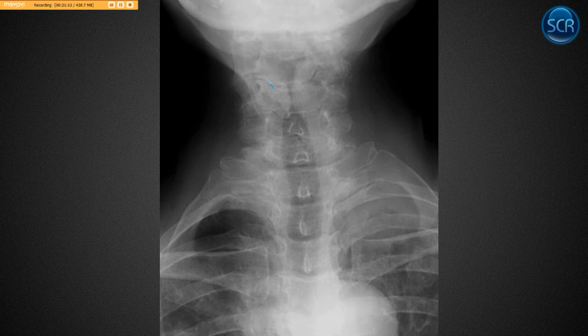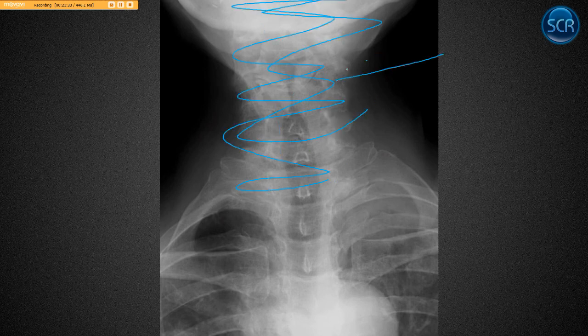In this example, we see some really prominent uncinate arthrosis, uncinate hypertrophy. Okay, we're looking down here. What's our search pattern for the frontal view? I go uncinates, right? Check those out. Facets, these are looking pretty degenerative. Those are the main things in the cervical spine, but you always want to make sure, and sometimes I do this first actually. So let's get in the habit of not looking at this first, right? No one cares. We're not going to find much on the frontal view other than the degenerative stuff, and probably not going to get a question on that.